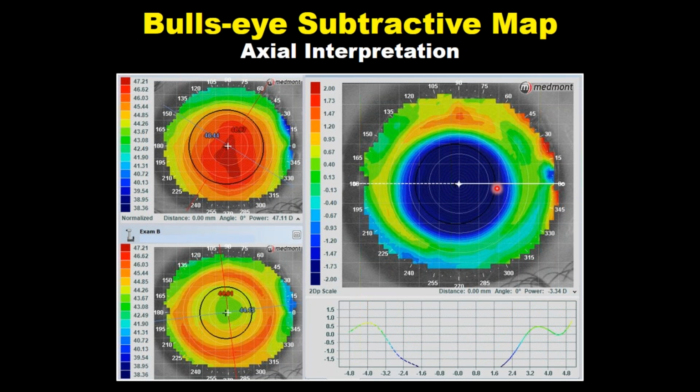It's a beautiful bullseye, but these are some of the nuances that you can begin to understand about centration. Is it slightly low as opposed to 100% centered? And if it's slightly low, is that due to lens displacement, or sorry, is it due to the displacement of the apex of the eye or the cap of the cornea?